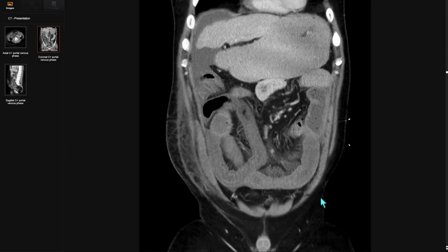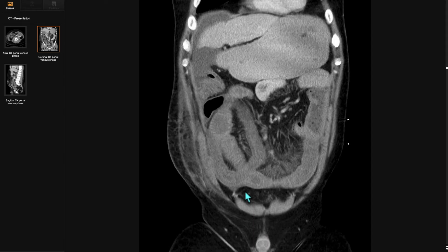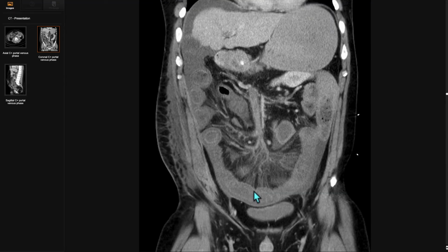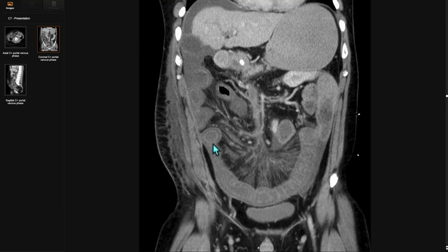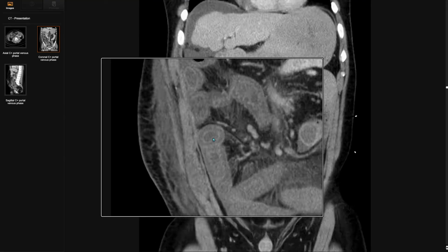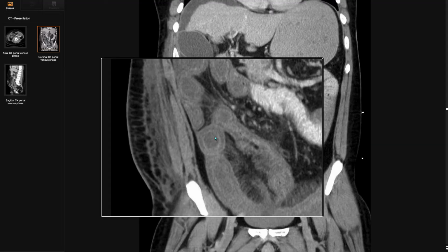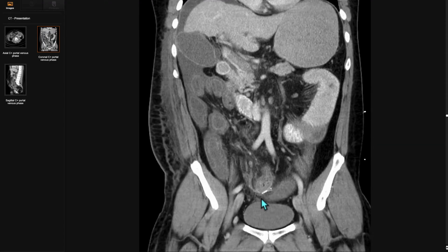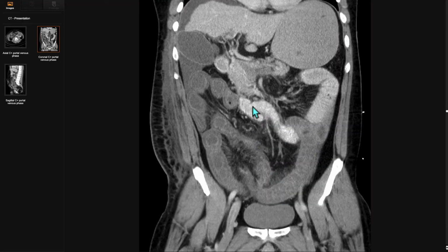This next patient at first glance might look a lot like our ACE inhibitor-related angioedema or eosinophilic gastroenteritis patient. You see that same pattern of long segment small bowel wall thickening. You even get a little bit of target sign. However, the degree of enhancement is overall somewhat less, and this post-operative history is important in this patient. The patient had a total colectomy due to the diagnosis of ulcerative colitis and developed worsening abdominal pain after surgery.